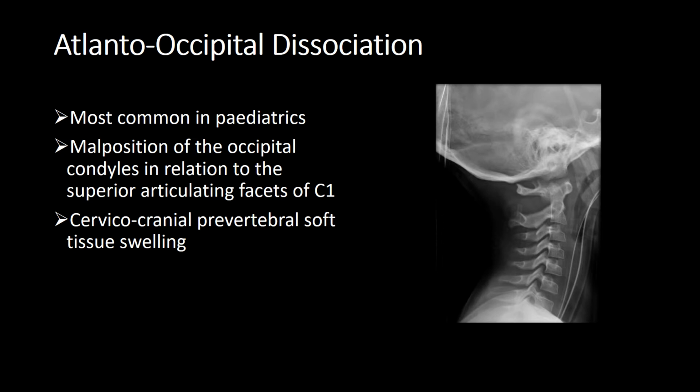So you get malpositioning of the occipital condyles in relation to the superior articulating facets of C1. You get cervicocranial prevertebral soft tissue swelling. It's a very significant injury.